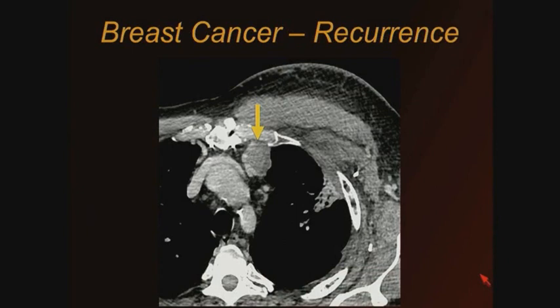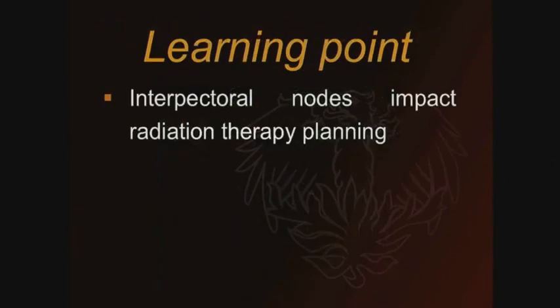And then when we're following patients with breast cancer, nodal disease recurrence is unfortunately one of the most frequent types of recurrent disease. We can see how this patient already had nodal dissection in her axilla, probably focal local radiation. We can see an area of radiation fibrosis and a metastatic lymphadenopathy in the internal mammary nodal chain, which is a very frequent site of disease recurrence.